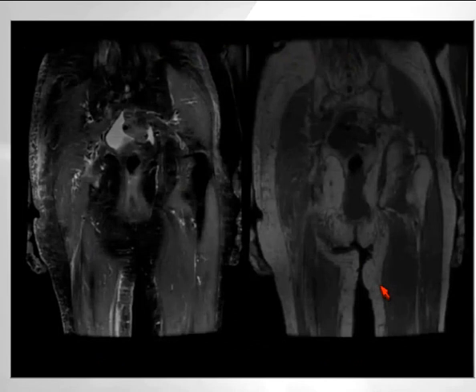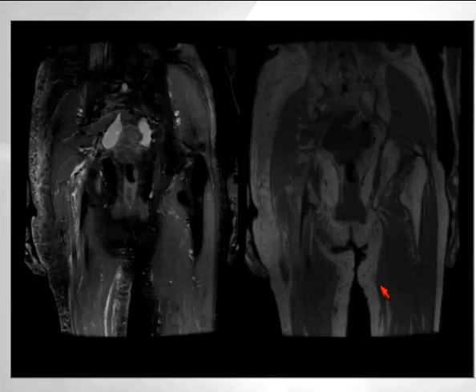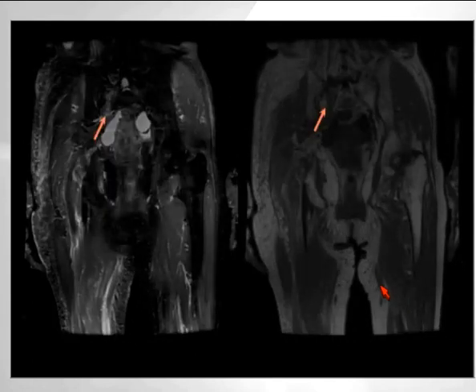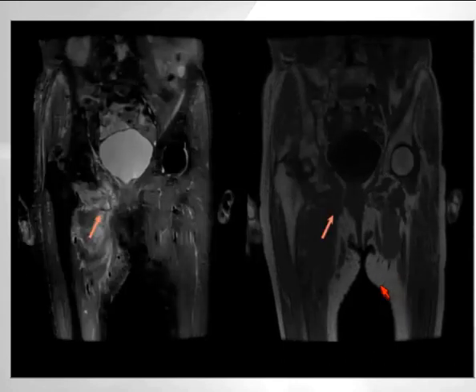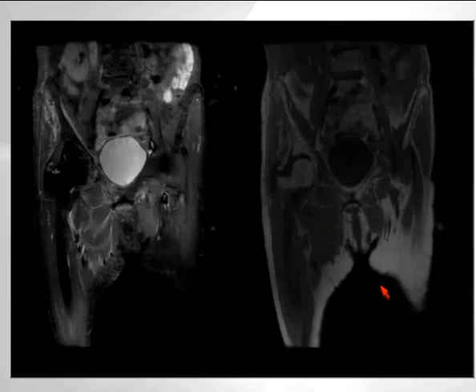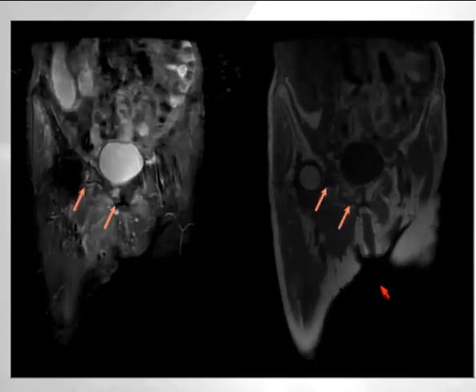So let's go over this, now that we are doing more and more abbreviated hip MRI in the emergency department. Always try to think of the posterior and anterior arches because you're looking at the pelvis. Start from posterior, and immediately you would look at the sacrum, and there's a non-displaced sacral fracture with a lot of edema. Then we continue to move forward, and we start seeing this inferior pubic ramus fracture with marrow edema, and then we have the superior pubic ramus fracture and parasymphyseal fractures. So most often these fractures are multiple.